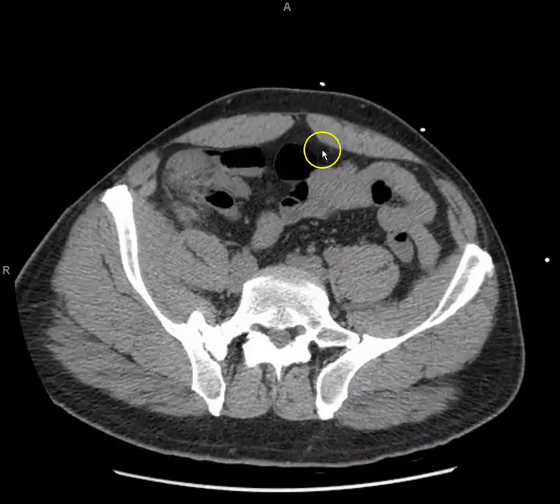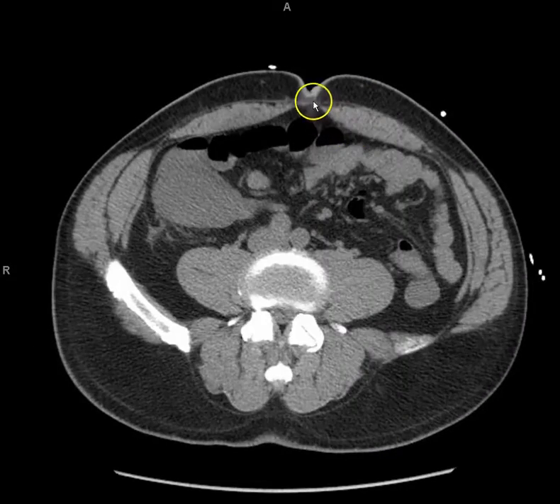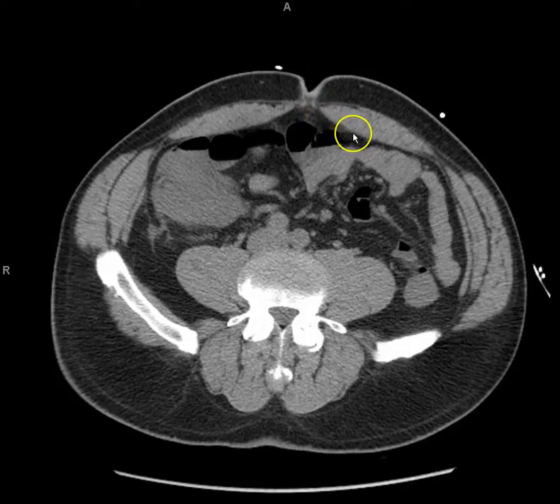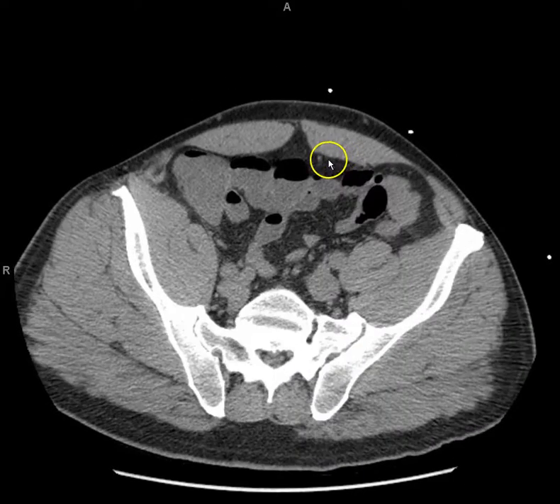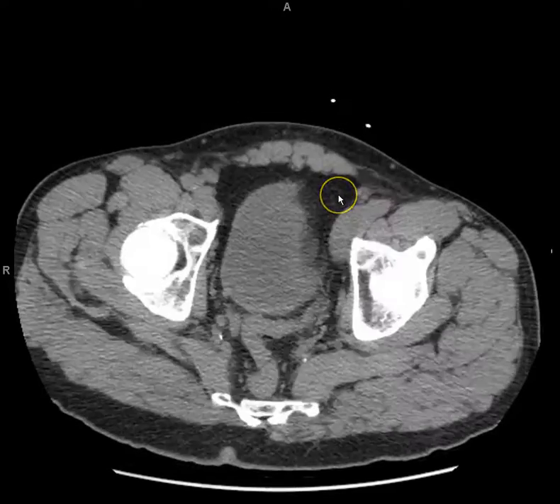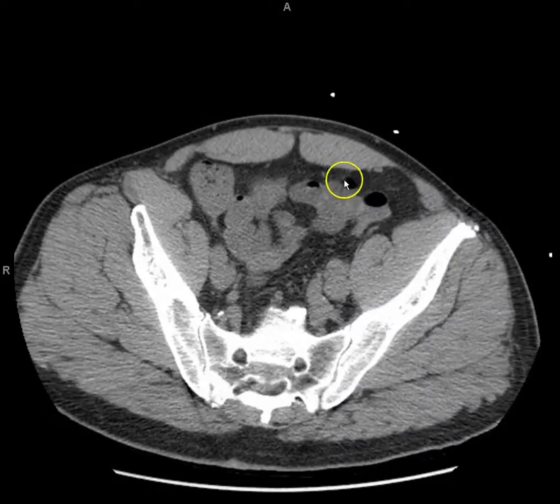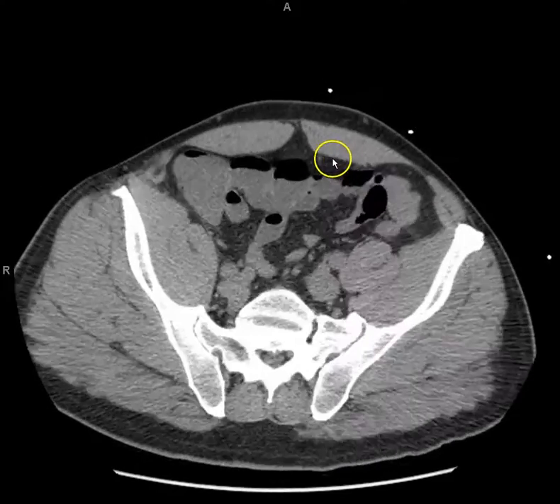Goes up. There's the belly. It's the residual, they're not functional anymore, right? No, you're thinking of the urachal remnants. Yeah. No, this is not that.